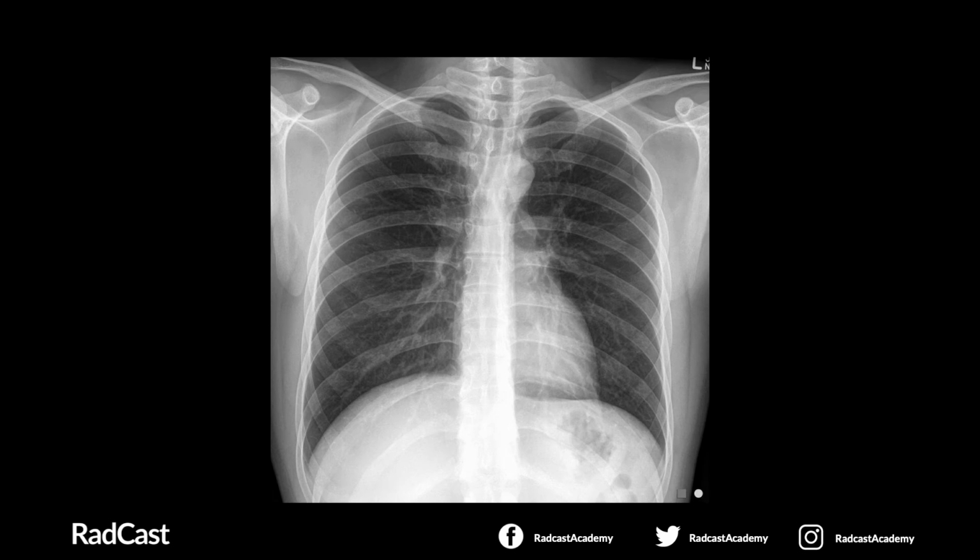So now that we've gone through how to assess breathing, let's look at our normal chest X-ray again to look through some of these points. We're going to look up and down the entirety of the lung fields, and at each point, divide them into upper, middle, and lower zones. We're going to compare each zone bilaterally to make sure we evaluate for any infiltrates, lesions, or masses. We're going to check the apices or the tops of the lung fields, making sure that we evaluate for any abnormalities such as a pneumothorax or a mass.